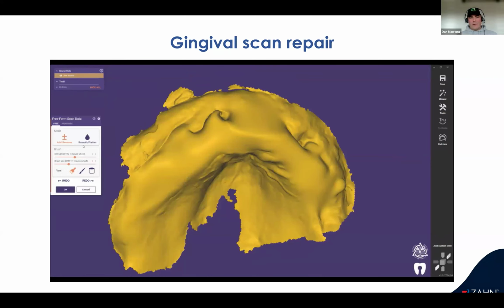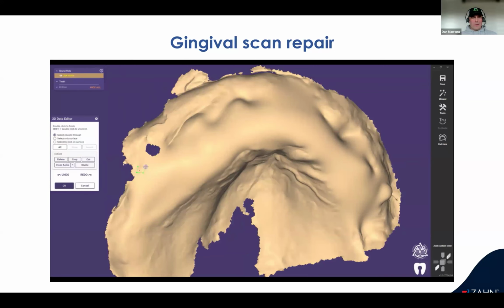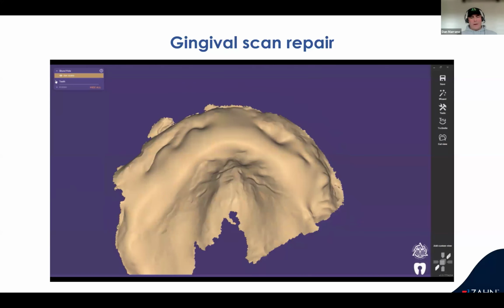During a surgery, they spend 2, 3, 4, 5 hours in a complicated surgery. No way am I asking them to rescan this. And you see these little marks here, they'll mess up your tissue. Just cut them out, fill in a hole. And just as easy as that, we're cleaned up and we're ready to put tissue on that.